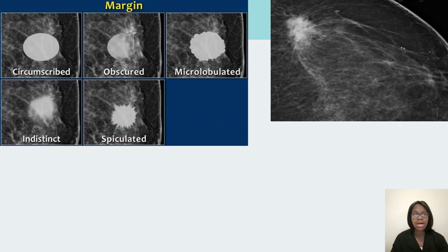So here is how your different margins look on mammogram, and also on ultrasound as well, breast ultrasound.